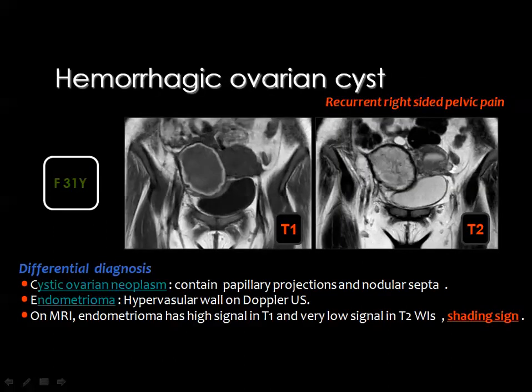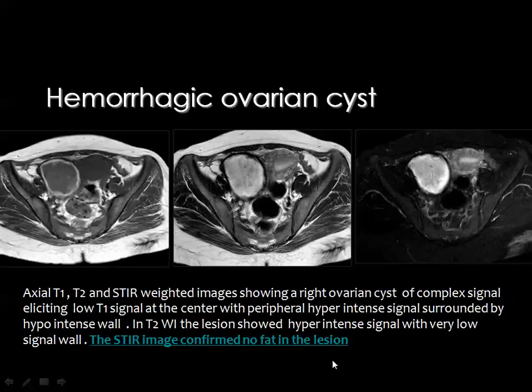Then if you look at the MRI T1 weighted image and you see this margin of bright signal which represents blood, and then on the T2 weighted image, the margin is relatively darker, this means that you are dealing with early subacute blood, or what we call intracellular methemoglobin.